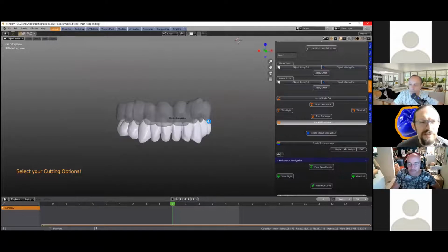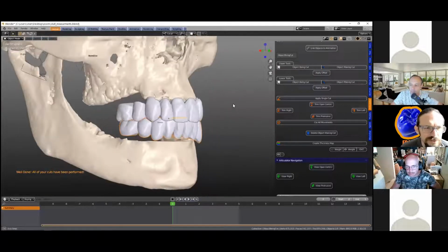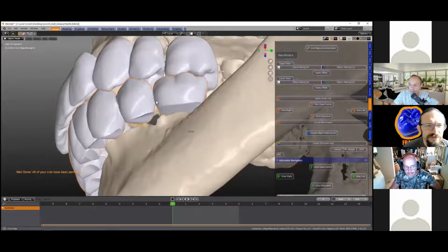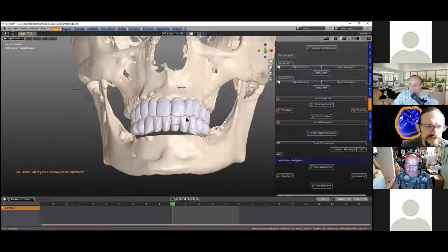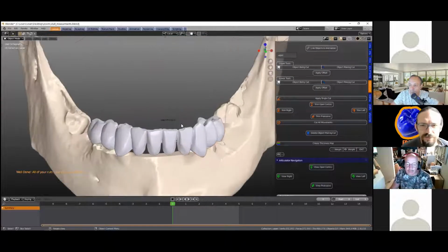You know, Michael, this type of operation takes a lot of time to calculate. Perhaps we could have some nice tooltips saying that, okay, first cut is done, second cut is on the way, because during the scripting you can put this little information in the tooltips. You have a very fast computer there, but when we have a slower, less powerful computer, it can take like 1 minute or so to do all the cutting movement.